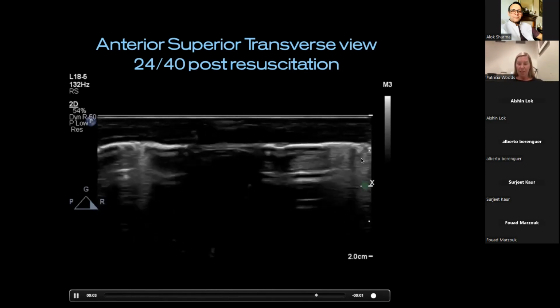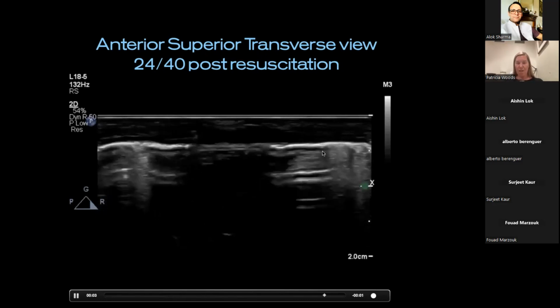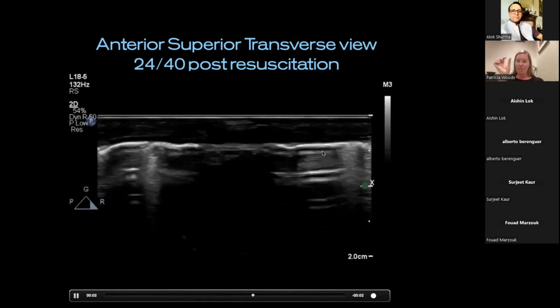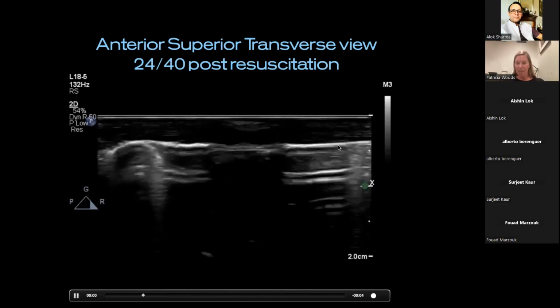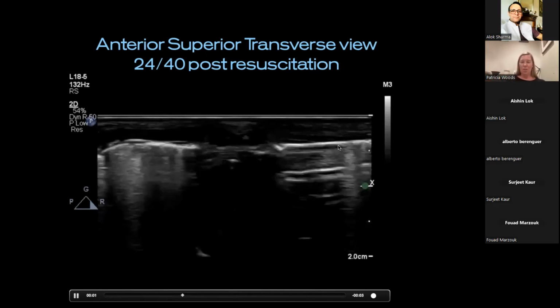And over here, it appears again to be a bit of a change. And this is common, isn't it? Sort of parasternal areas. But again, I can't assess depth. I can think about this, that this is probably maybe 0.5 centimeter across before you start hitting this area. So is this significant? You've got to put it in context.